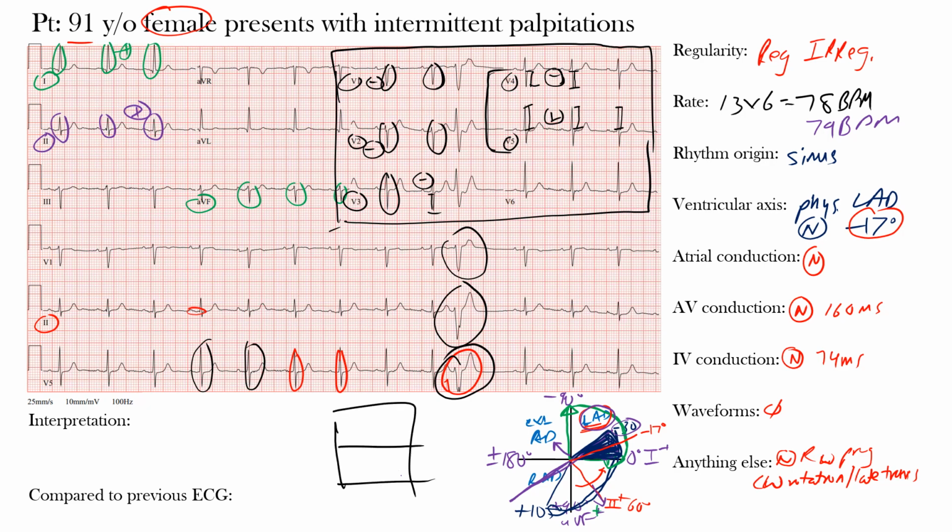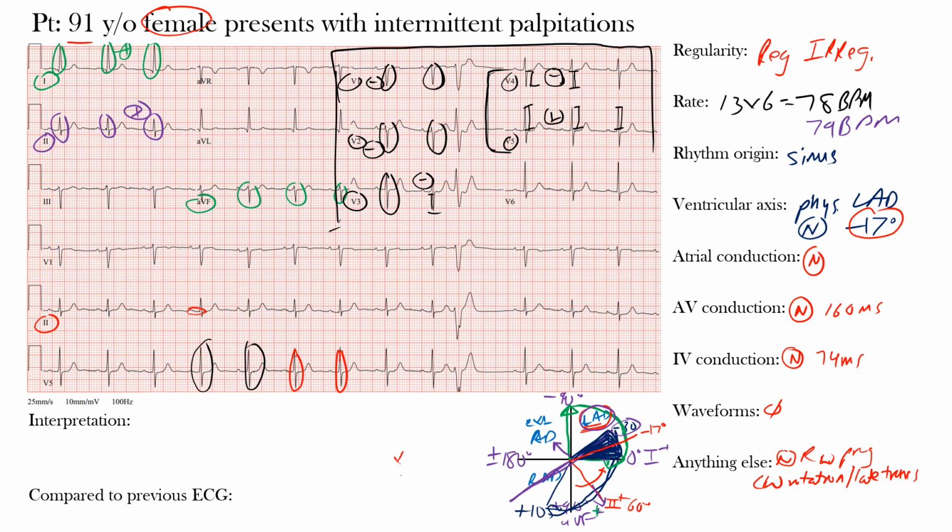So if we draw our system, remember these are our ventricles. Normally we start up here and come down, but if we're coming from some point within our ventricles, somewhere you have this ectopic focus, one of these that then fires, but it's outside that conduction system, and you have the slow cell-to-cell depolarization, and that's why you have these wide complexes that result, okay? All right, so just to erase, so you can see that these are all wide complexes, and notice that the beat is coming earlier than expected, okay? Normally we would expect the QRS to maybe come here, but it's occurring there, okay?